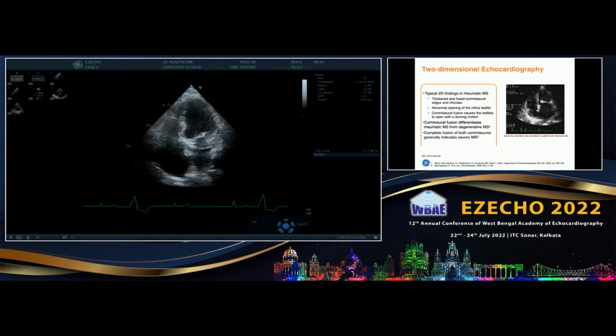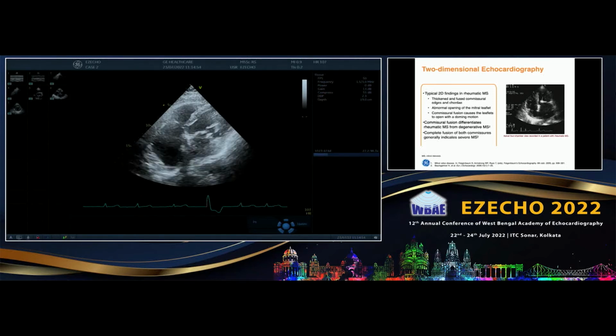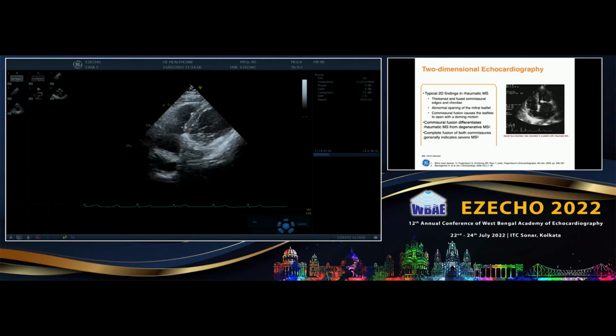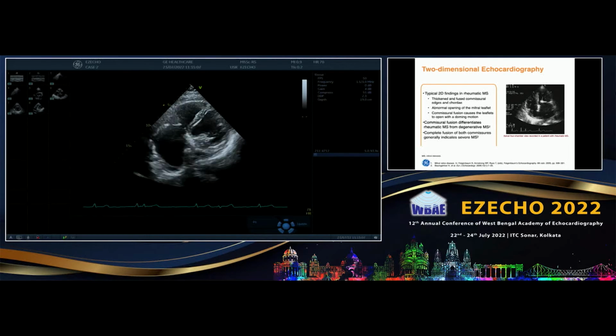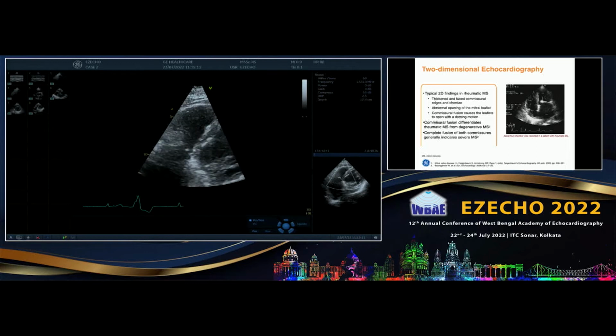So you look at the tricuspid annulus remodeling rather than the volumetry of the TR, because the TR volume changes within minutes, by a change in the preload. So you may see almost a trivial TR when they are anesthetized and you are doing it intraoperatively, and they come to the ICU and there is a florid TR. So you have missed the bus if you don't look at the tricuspid annulus at that time. So we'll look at it.